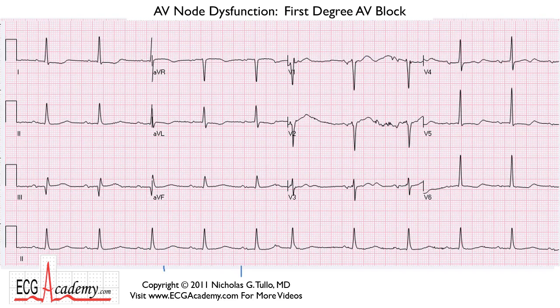Well, the last cardiogram I want to show you has a very interesting physiologic finding. We talked about the AV node and how the AV node delays the signal slightly. But what you have to appreciate is the degree of delay down the AV node has a lot to do with the atrial rate and has a lot to do with how quickly beats reach the AV node. And here's an example of what I'm talking about.